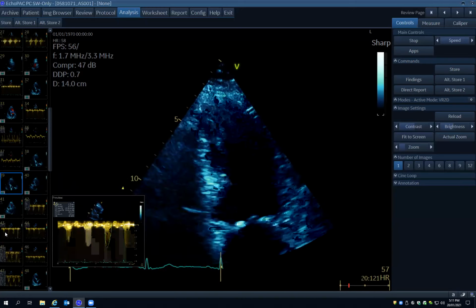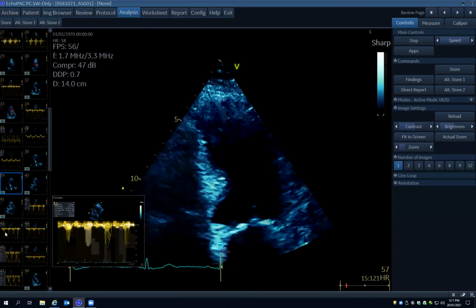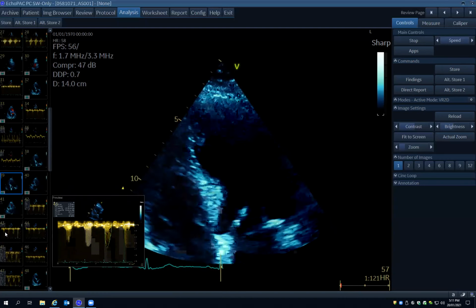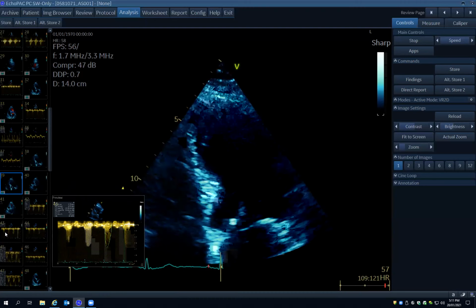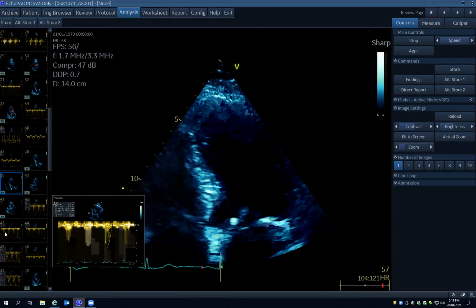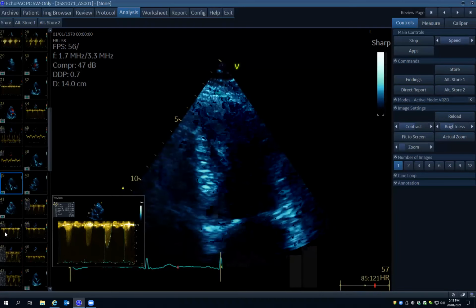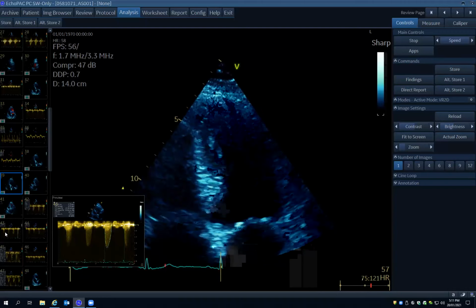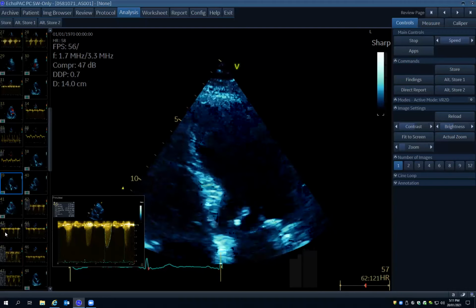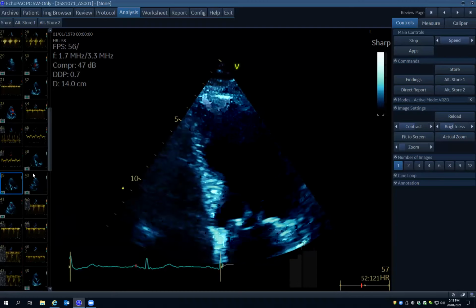So whenever I look at the 4-chamber view and your cardiac function, I make sure that a mean gradient of 20 or 30 may not be a low flow, low gradient situation. So I can be confident that I can rely on the numbers that I'm getting. Nice. And I can look up the guidelines and be sure that these numbers reflect the system. So make sure that we've not got low flow, low gradient aortic stenosis potentially. Make sure we don't have pseudo severe things like that. Yeah, cool. And we'll maybe talk about those another time.